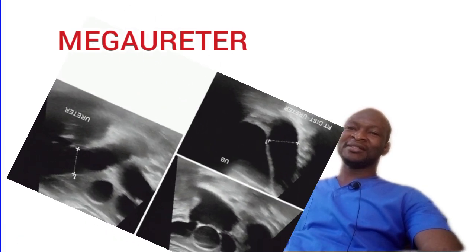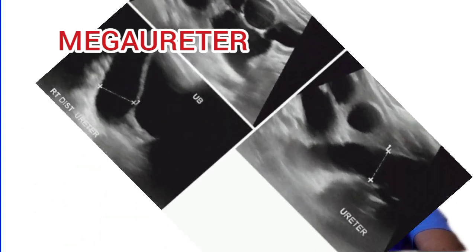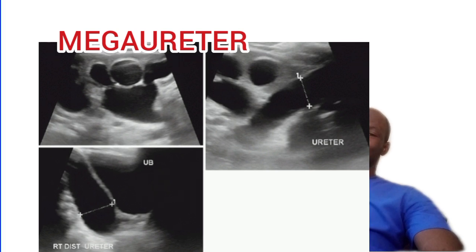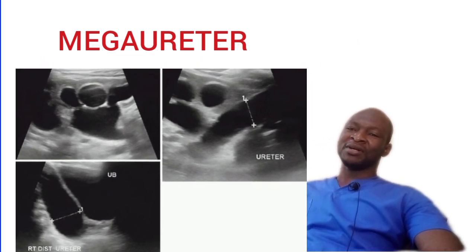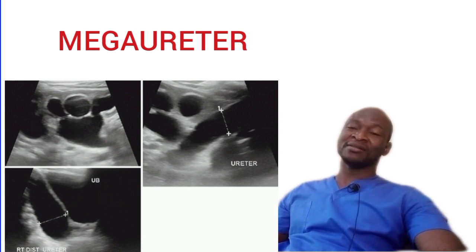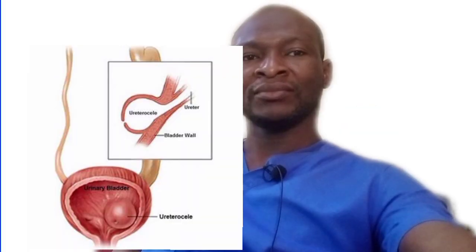Megaureter is an anomaly where the distal ureter is abnormally dilated. It is an uncommon condition which is more common in males. It may be bilateral, and can often be associated with other congenital anomalies. The cause is thought to be due to aperistalsis of the distal ureter, leading to dilatation and functional ureteric obstruction and a tendency to infection. The ureteric orifice appears normal and a ureteric catheter will pass through easily. On ultrasound, you see a fusiform dilatation of the distal third of the ureter. Depending on the severity, hydronephrosis may or may not be present. Calculi may form just proximal to the non-dynamic segment.